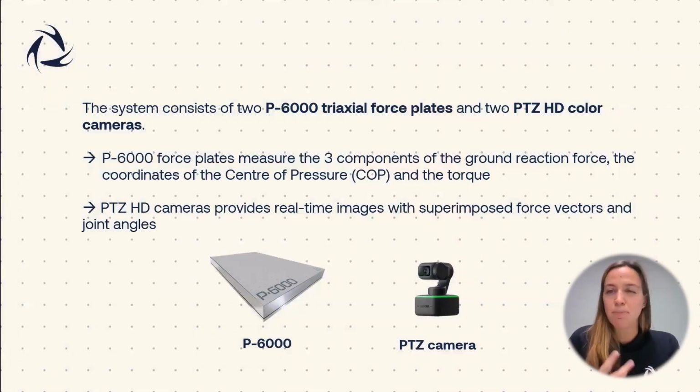But what is Podium exactly? Podium is a system constituted of two P6000 triaxial force plates and two PTZ HD color cameras. The force plates measure the three components of the ground reaction forces, the coordinates of the center of pressure and the torque. The PTZ cameras, which are HD color cameras, provide real-time images with the superimposed force vectors and joint angles.